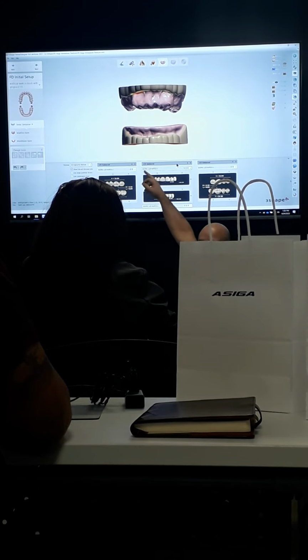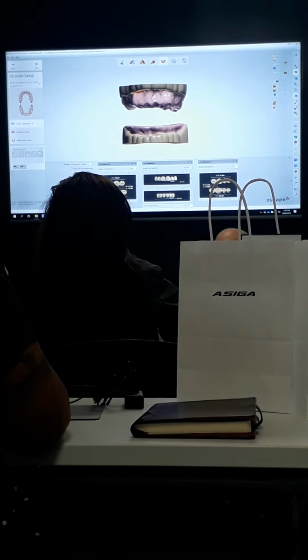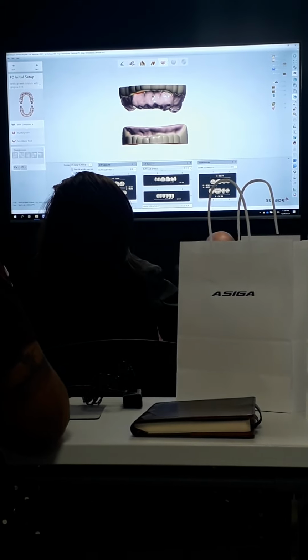So with the occlusion, this particular default one here is a balanced occlusion. If I want to see what it looks like in the space, I can just hit the apply button. And then it's going to populate up there in the 3D space, and I can look at it, make sure the size is good, see if I like the way it looks there.